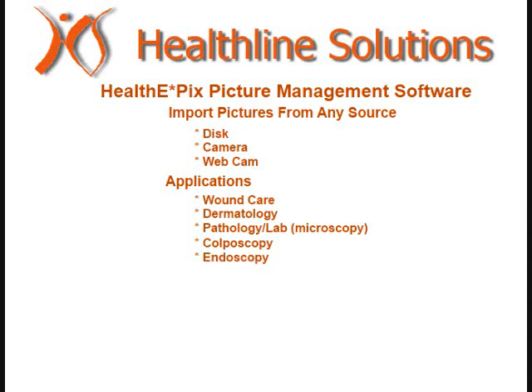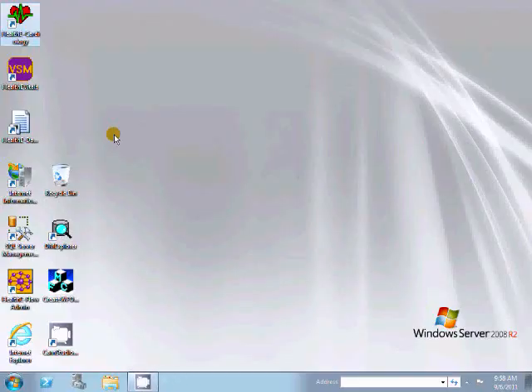Endoscopy, in general, benefits from having images captured during the exam, as does colonoscopy in particular. This demonstration will use wound care as an example. We'll start by logging into our workflow.